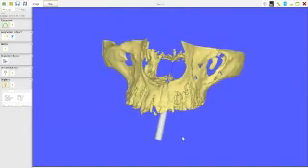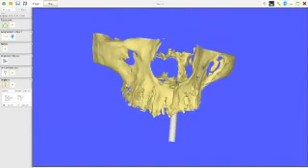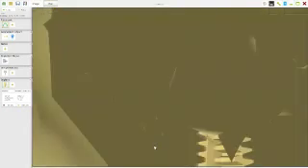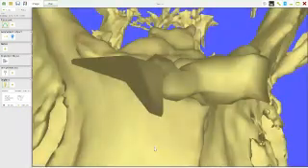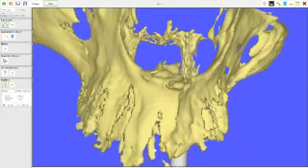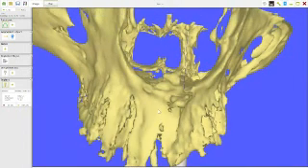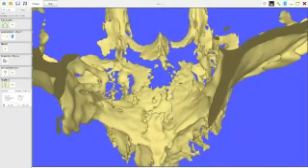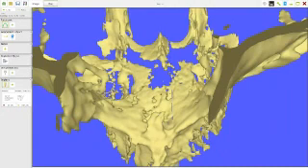push the thing, sorry, is it left-click? Oh, no, sorry, it's press down on the rollerball thing on your mouse. If you press down on the rollerball on your mouse, keep it down and just move, you can see how I can zoom in on the image? Yeah. I'm going to zoom in, I've right-clicked, I've pressed down on the rollerball, and then I'm going to left-click, and look, I can actually make out the implant there.